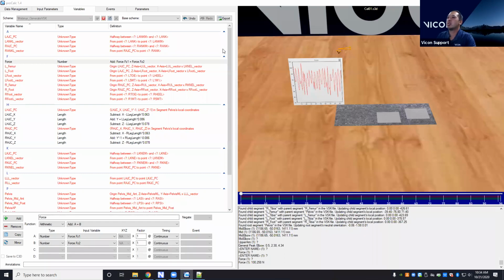So I'm not sure necessarily what you mean by calculate a segment between A and B. Are you saying that? I'm not too sure. You can certainly get the average position of 2 markers. Oh, okay, sorry, a vector going from A to B.